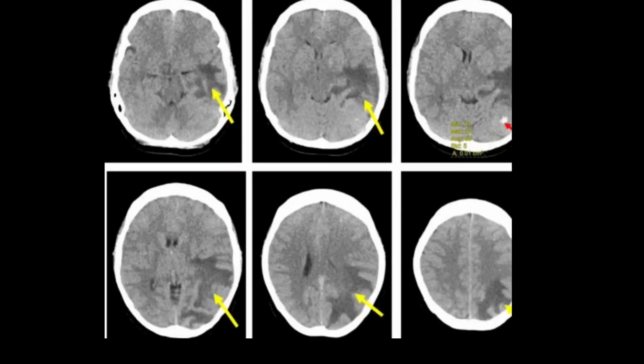A few examples for the better understanding of anaplastic astrocytoma of grade 3 WHO classification. As I explained, it is extensively infiltrative with high vasogenic edema, which is visible on these images.